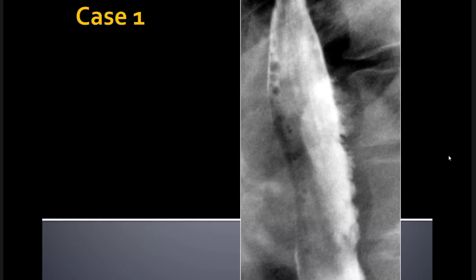Then it would be anything else you can think of? Then it would be more in favor of inflammatory ulcers. Yep, such as? Any corrosive intake? Yes, yeah, absolutely. Okay, so if you were going to give me one thing, what do you reckon this is? So you've mentioned some good differentials. What do you reckon, given that there's deep ulcers?